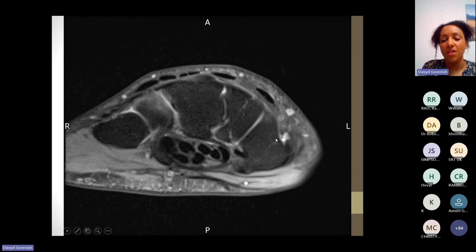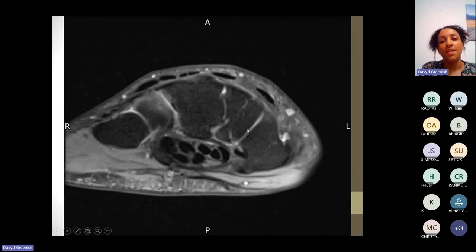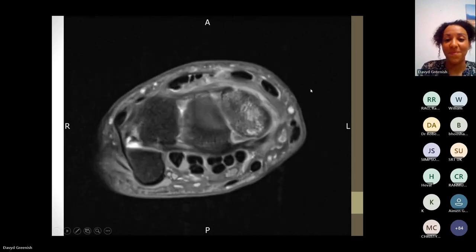If you scroll through and get used to looking at all of the different carpal bones, if you look at the pisiform in the lateral view, for example, you can see that it sticks out slightly anterior, so it's more on the palmar side, and that can help you as well. The scaphoid points forward, and it's just finding little tricks for the exam that give you landmarks to look for, so you have an approach and a system, so you don't panic when you're faced with these images.